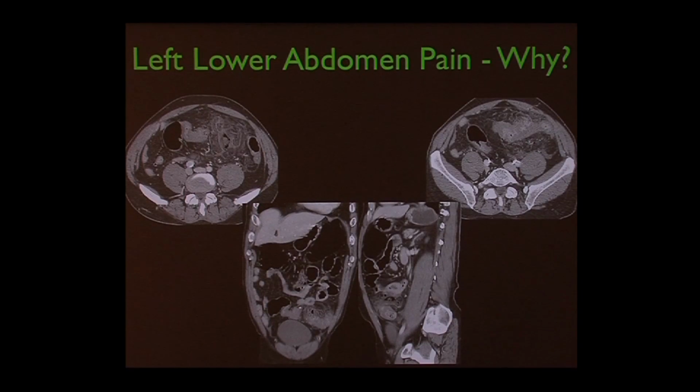Here's a left-sided pain. Not the appendicitis. Well, actually, the appendix is variable. It can sometimes be on the left side. If the bowel is flopping around and it's a long appendix, it can actually cause pain on the left side, but that's unusual. This is not appendicitis. And the abnormalities, here's bowel, and this conglomeration of material is some gas that's not in the bowel, and some inflammation, some edema, making this gray, disorganized looking appearance. This is some bowel, and then some more inflammation.